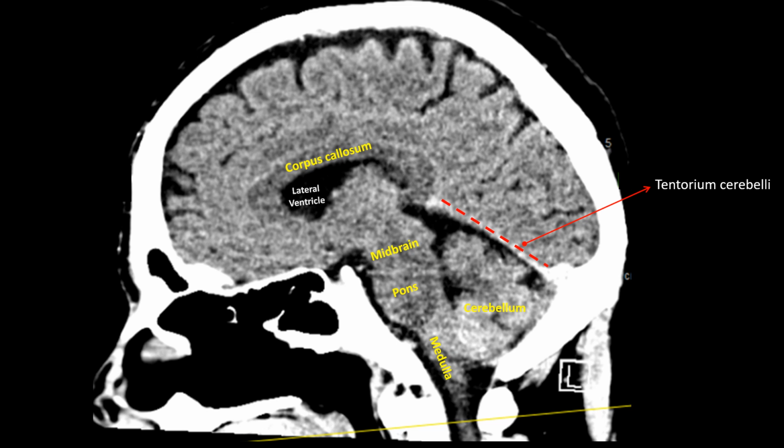This is the lateral ventricle filled with CSF. Inferior to that is thalamus. Above the corpus callosum, you may recognize 3 lobes. Anteriorly is frontal lobe, followed by parietal lobe, and then occipital lobe as you go posteriorly.